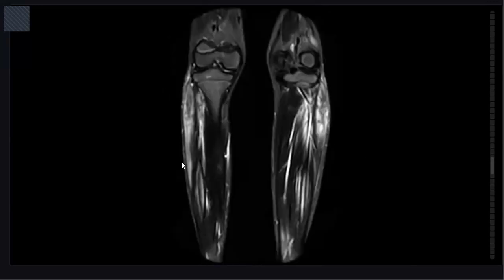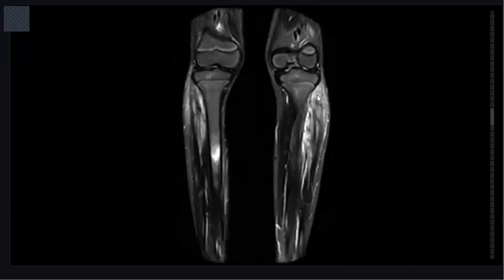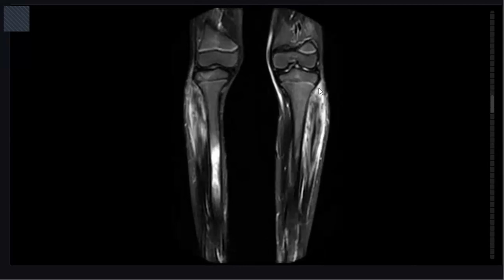Then we showed you the other areas of involvement of the bones. So it is chronic recurrent multifocal osteomyelitis. We can refer this patient to the rheumatology team, and the patient needs non-steroidal anti-inflammatory drugs. Actually, it is a diagnosis of exclusion. Multiplicity is common, and it may show so much bone expansion and then sclerosis at the late stage.